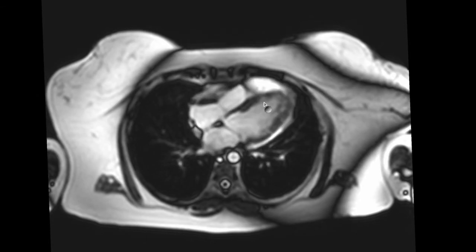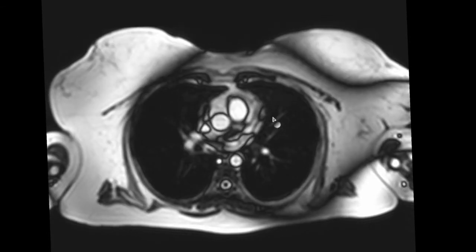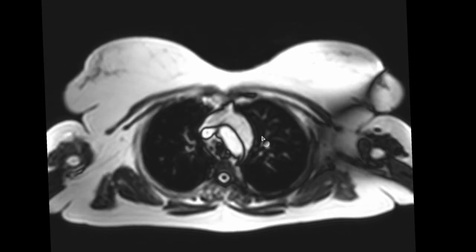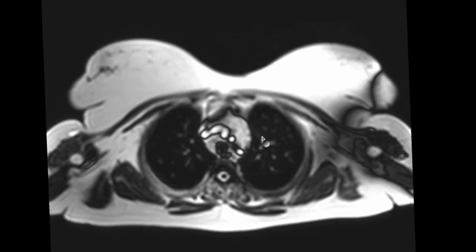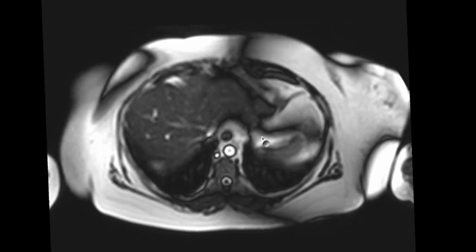The left atrium further drains into the left ventricle, and the aorta arises from the left ventricle. Follow the aorta. This is the ascending aorta. Then the aortic arch, which is left sided, the branches of the aortic arch, and follow the descending thoracic aorta to rule out coarctation. The further details regarding the segmental approach towards congenital heart diseases, including the morphology of ventricles, atria, visceral situs, and everything will be covered in the next topic.